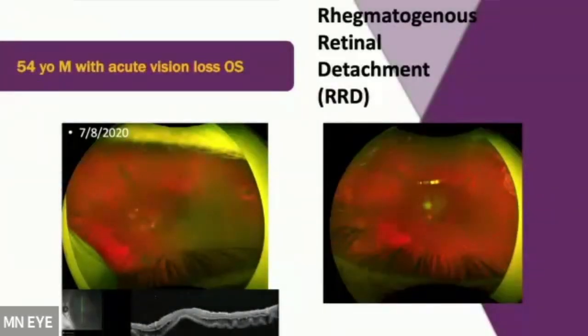So this is a 54-year-old patient with acute vision loss. So it's very obvious, this horseshoe tear in Optos picture. There is a lot of, excuse me, so retina is detached, macula is off. So there is a lot of discussion now in the literature last few years about the OCT features of outer retinal corrugation, no corrugation, elongation of photoreceptor outer segments, and the importance or relevance of that to the visual prognosis.